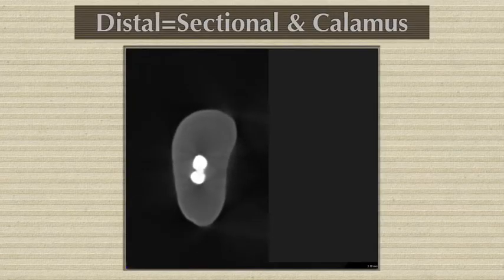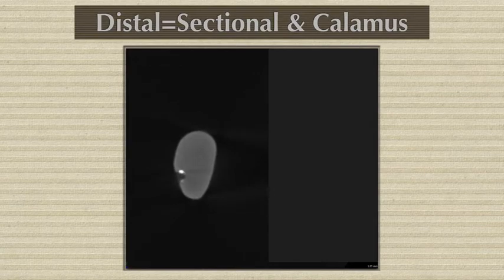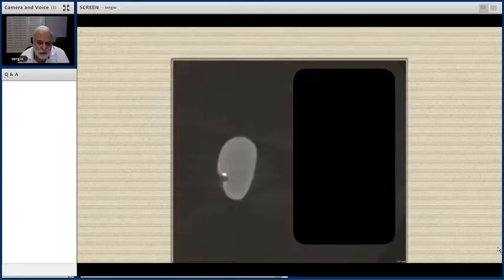And you're going to say, well, what is the importance of these voids? I'm pretty sure there is no study until today that has been able to ascertain the outcomes if we have voids over time. It would be very difficult to ascertain that because we cannot put a patient's head inside a micro or nano CT because of the amount of radiation. But imagine if one of those voids is near those complexities of the anatomic canals, and it has any contact towards the outside of the canal. In the beginning, we will probably have a very good outcome, but later on, I really don't know.